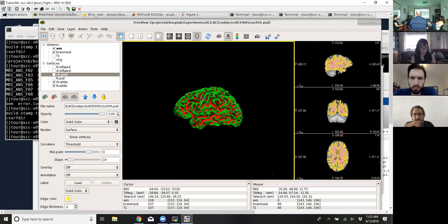my assurances that you'll want to switch over to command from the command line. Is this actually by default it's pulling it up? That saves one additional step you have to take. It's just hard to judge. Sure.